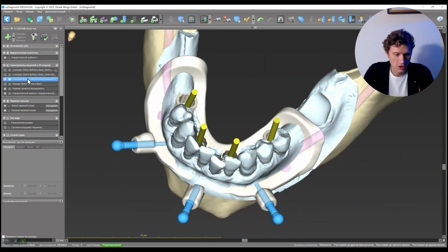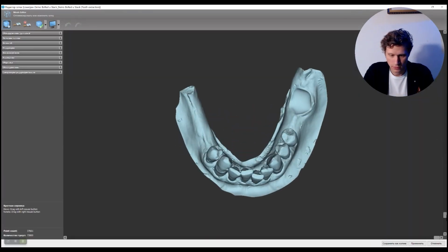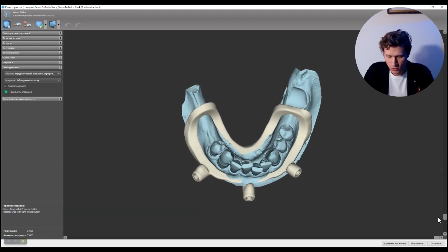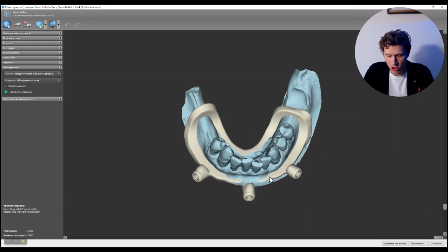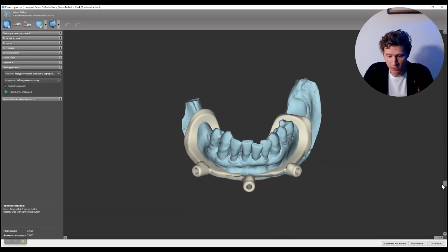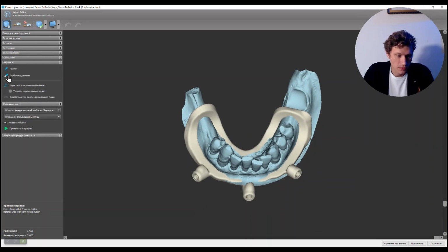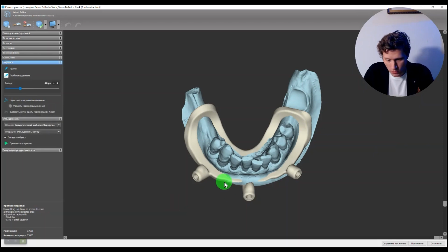So what I need is this border. I open this model in the mesh editor. In the combine I select the object surgical guide. And you see what's in the way? We're on a soft tissue pathway that will be separated. I need to remove these soft tissues in the file. For this I take the cutting tool eraser. You can take the eraser that cuts from the top, or you can take the deep eraser. And I carefully trim the file.